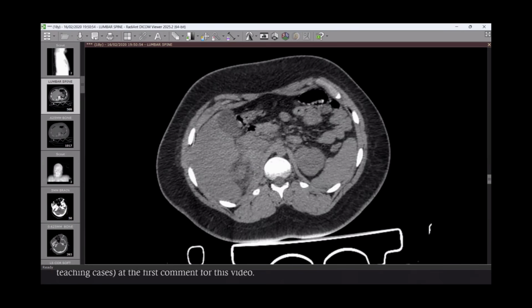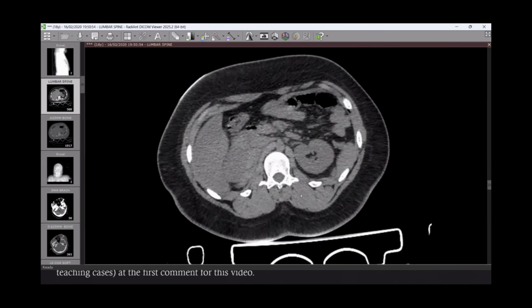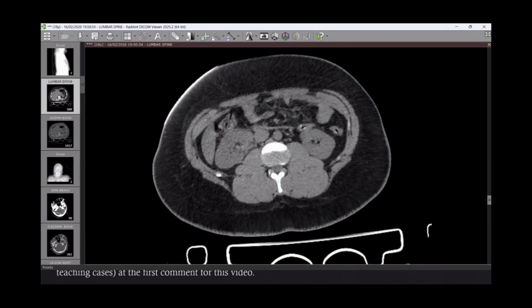Can you go more inferiorly, please? More down. Can you stop here? Around the kidneys, I couldn't really separate the upper pole of the kidney from this region, which could also be hematoma in the right upper pole of the kidney. Where is the location here? Can you give me a more precise location? Just one second, I have to go up and down.